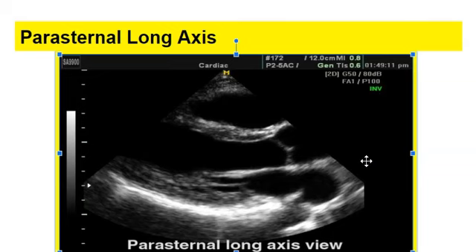So the ASE developed these guidelines, and that index marker is on there for a reason. And if you notice on our screen when we do echoes, I think I pointed this out to some people in the class, our index marker is corresponding to a marker on the screen. And that screen marker is on the right side of our screen. On the newer machines, it usually has a P up there on the right side of the screen at the very top. And our index marker corresponds to that. Anything our index marker is pointing to shows up on that side of the screen, the right side.